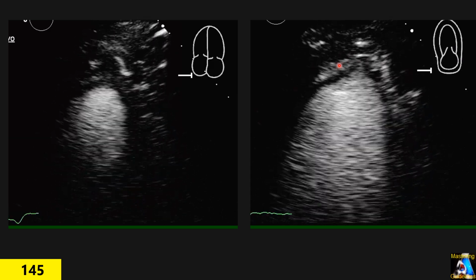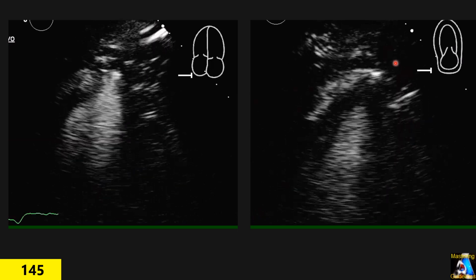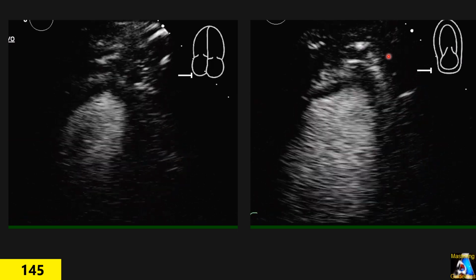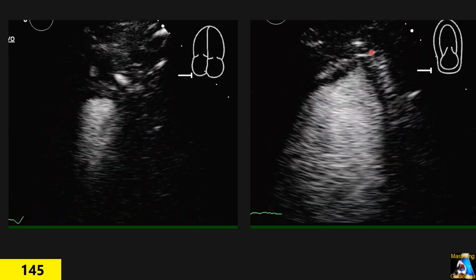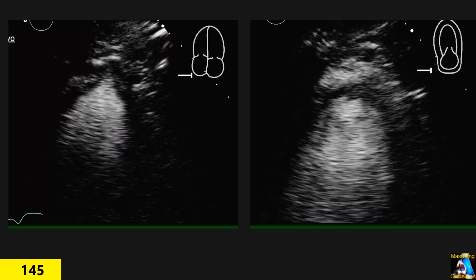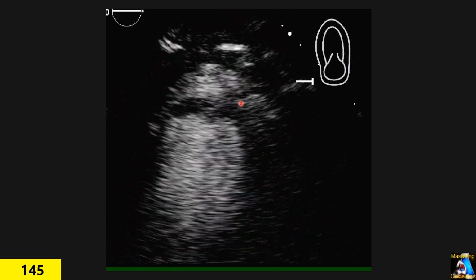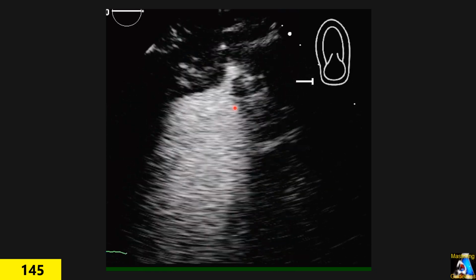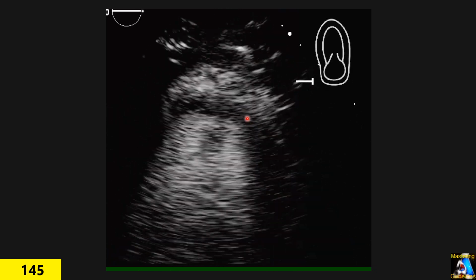If you put it all together, the contrast goes beyond the myocardium, and a little here there is some echogenicity and an echo-free layer that can be a fresh blood clot at this level. In the other view that I'm showing here, you can see complete myocardial rupture at this level. It is a classic pseudoaneurysm, but unusual in the apex.